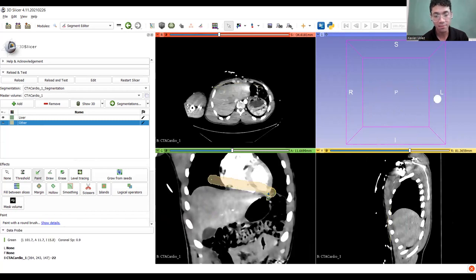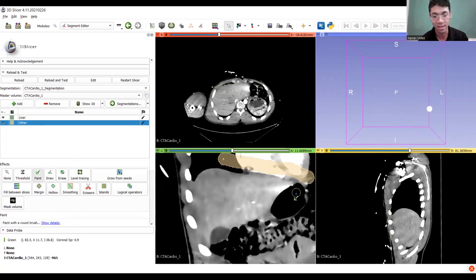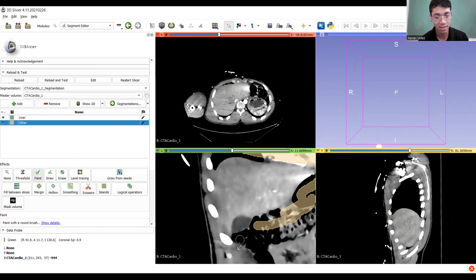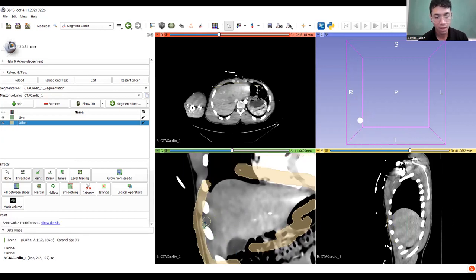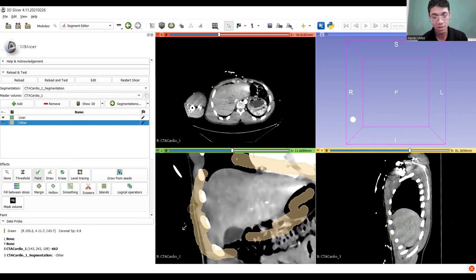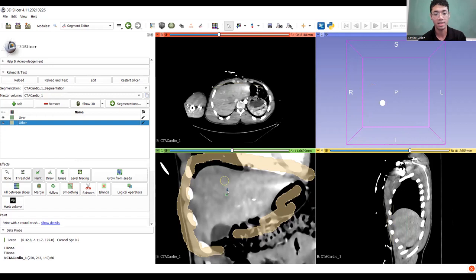So we definitely don't want that heart creeping in there. So I'm definitely going to put a big old line through that, that is not liver. And just all around there. We don't really want all that noise. Try to make it clean. Again, don't know what that is, I'm not going to touch it. And I might make it a little more clear that there's a line right here, like none of this bone stuff. None of that is, I don't even know if that's bone. Whatever that white stuff is, we don't want it. Get it out of here.